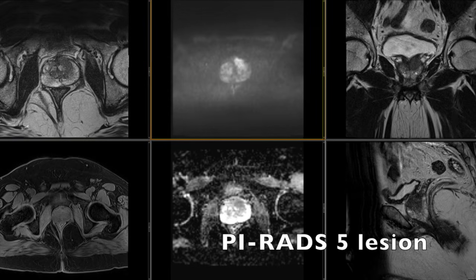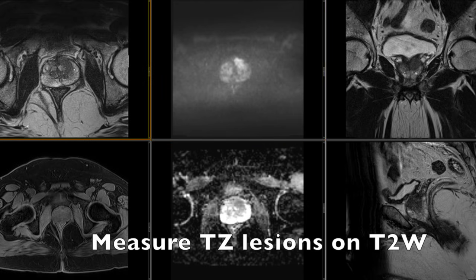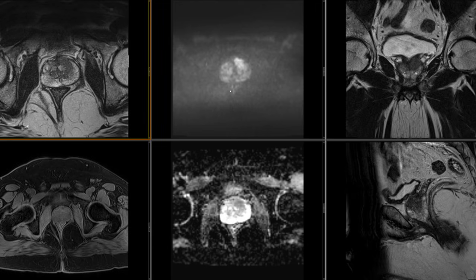This was a PI-RADS 5 lesion, again based on the size and appearance. This is over 1.5 centimeters, and there's likely extraprostatic extension here as well. So this is a PI-RADS 5 lesion. This is very likely to be clinically significant prostate cancer.